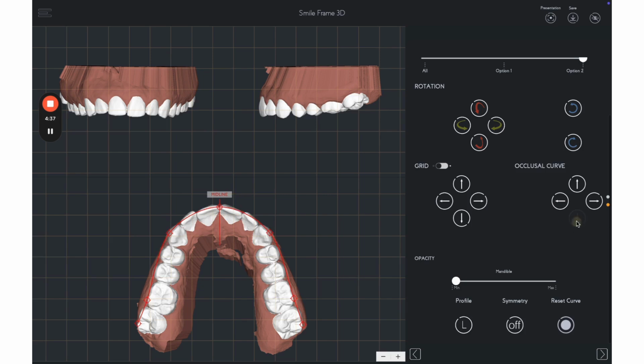Now, on the other hand, let's say if we want to do an ideal design and we have some areas that are subtractive, let's say here and here, then we want to keep the ideal position as much as possible of the teeth. And in the next steps, you can also digitally prep these areas of the teeth so you can export an ideal design. And later on, you can also import the prep model to create the provisionals based on the ideal design that you already started. Let's start with the additive mockup.